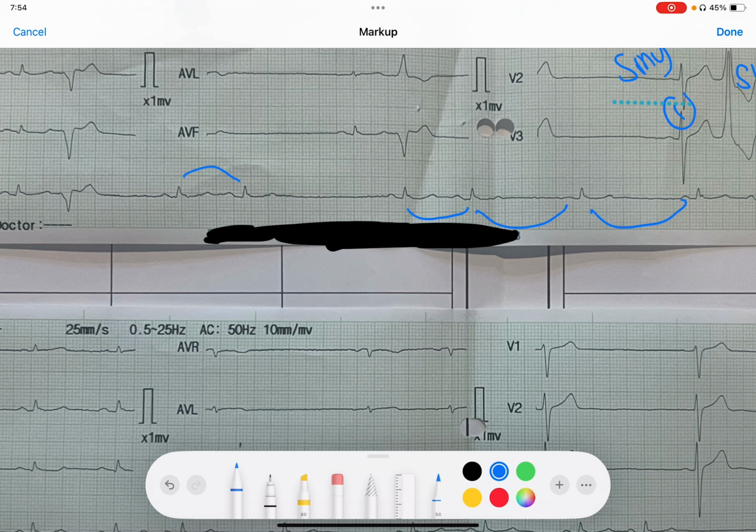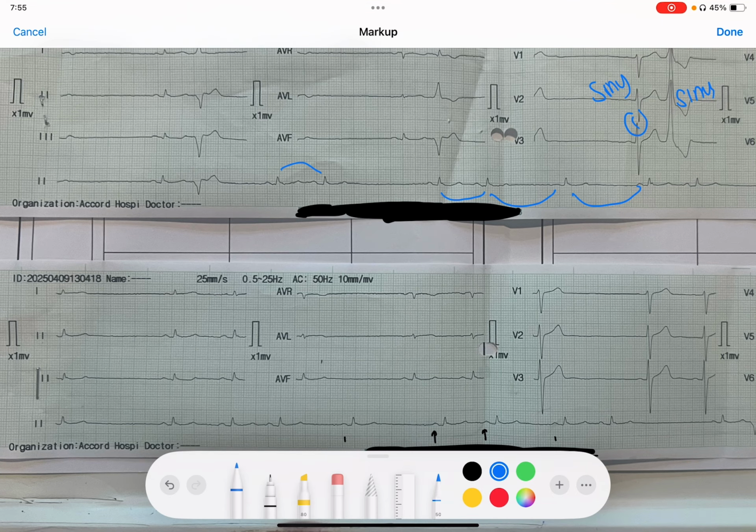a variability with inspiration and expiration. We know that with each and every inspiration or expiration, the heart rate increases or decreases. Whenever the patient does inspiration, the heart rate increases, and whenever the patient does expiration, the heart rate reduces. This is what we call sinus arrhythmia. But we must know that with this variation of inspiration and expiration, usually heart rate does not go less than 50.